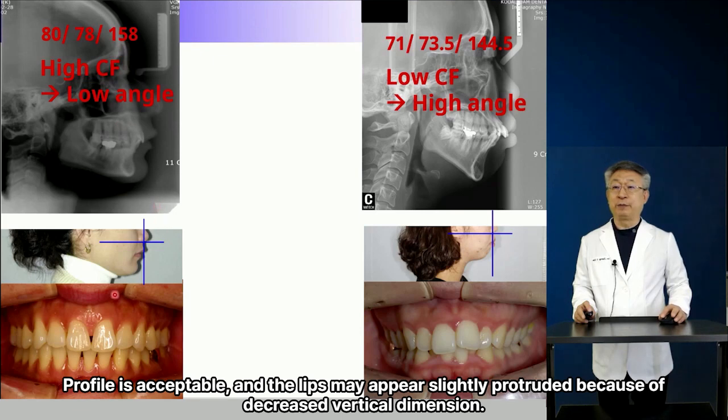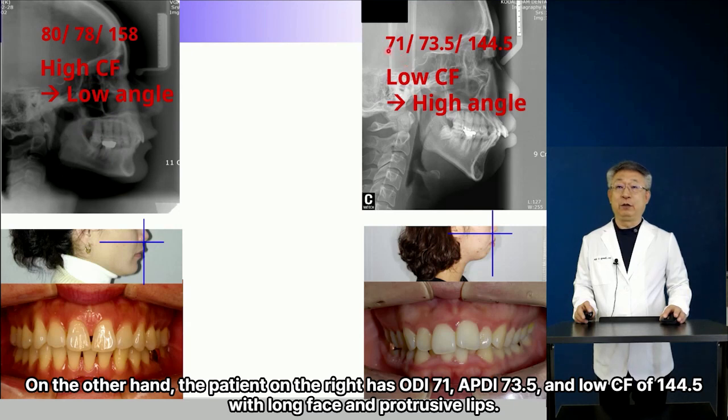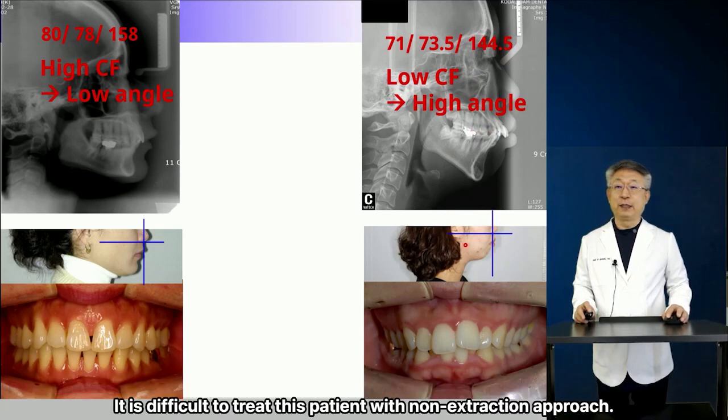Profile is acceptable, and the lips may appear slightly protruded because of decreased vertical dimension. On the other hand, the patient on the right has ODI 71, APDI 73.5, and low CF of 144.5, with long face and protrusive lips. It is difficult to treat this patient with non-extraction approach.